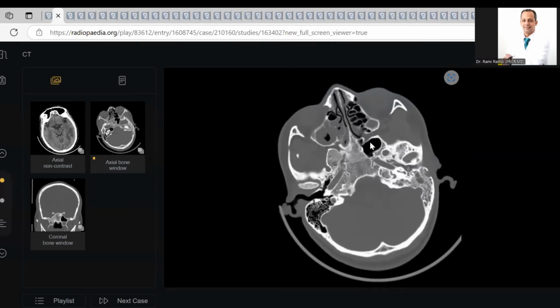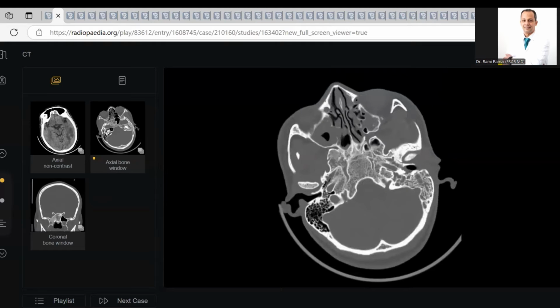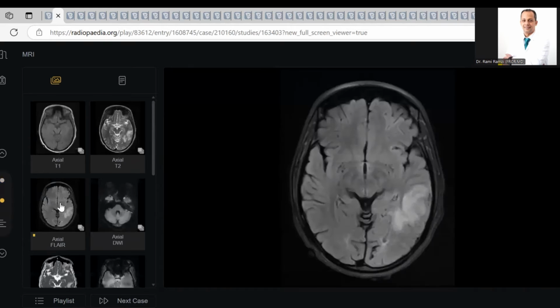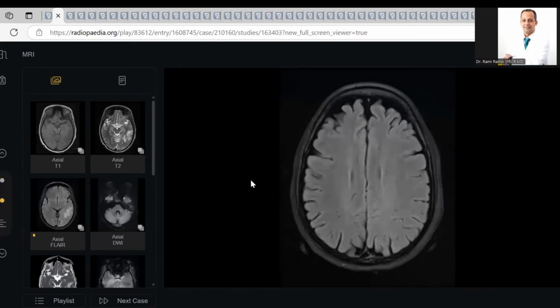Invasive fungal sinusitis. Second point, why encephalitis? See my colleagues, don't restrict yourself to one diagnosis. Give me two and tell me the first is like this and the second is like this. This may include encephalitis, okay, but this is finally venous infarction, classic venous infarction.